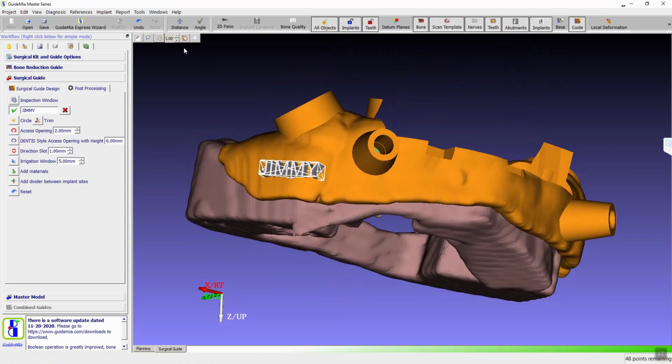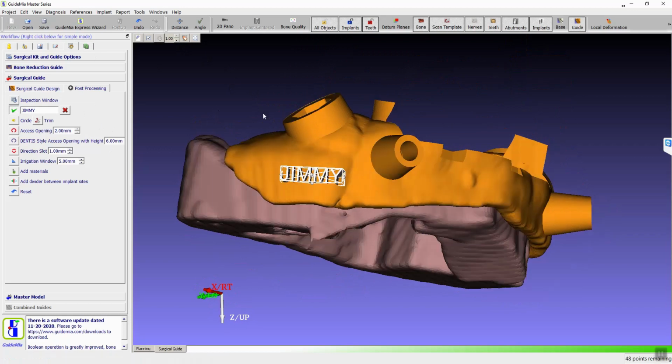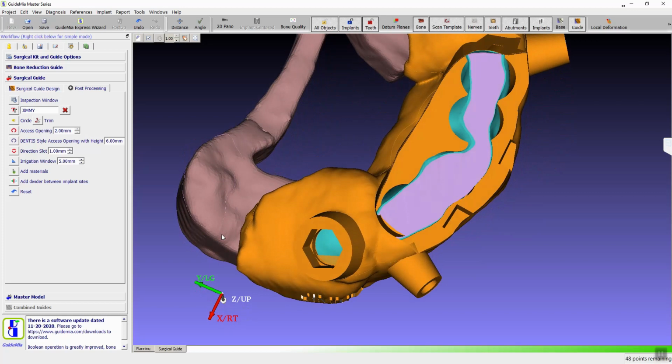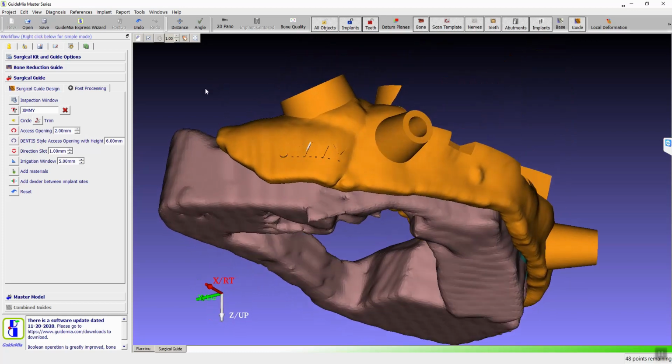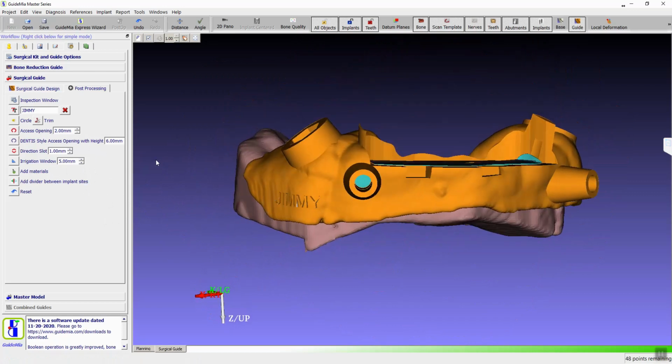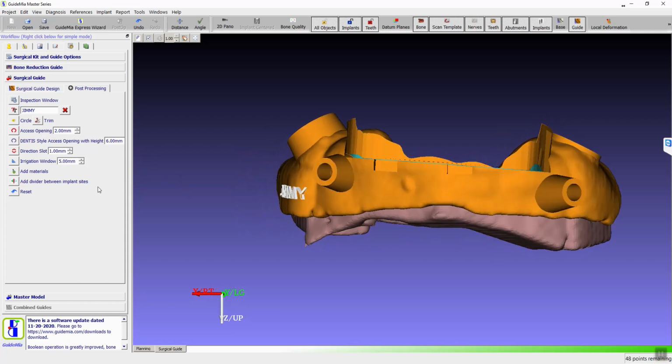That's about right. And when you finish that, it's going to cut a text here. Then as far as trimming, irrigation window, those kinds of things, you can always go to other tools. You haven't seen that. Now, I can add more than just one name, right? I can keep adding.